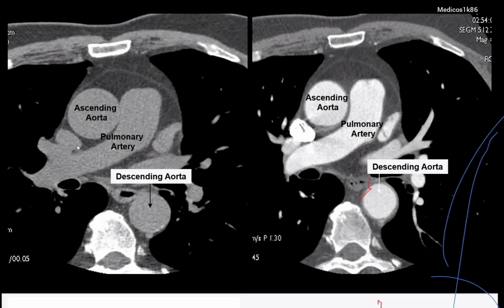When we give the contrast, we have to be careful. The contrast enhancement in the superior vena cava reaches around 2000, because this is pure contrast. Pure contrast gives artifact because of the very high enhancement, too much absorption of the X-ray. This is the reason you will see some artifact coming from the SVC to the ascending aorta.